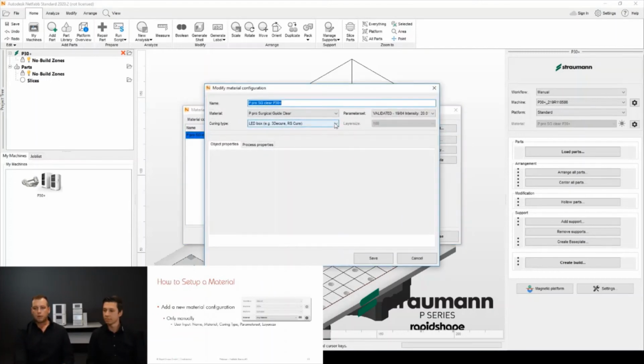So when we look at this post-process selection here, it's not affecting the printing process, okay? Because when you are post-processing a model or indication of your choice, that post-process is actually aligning the molecules in that design, which makes it a little bit smaller, okay? And depending on which post-process option you are using will determine how much shrinkage or behavior basically within the model will occur, okay? So when you select the flash box, the heat will be really high intensity, and then it just has a different effect on that post-process for that particular print, and it needs to be compensated in the printing process because the layers will be the same.